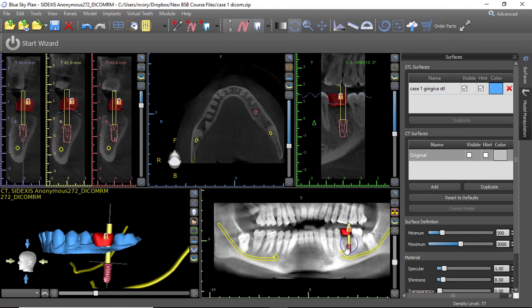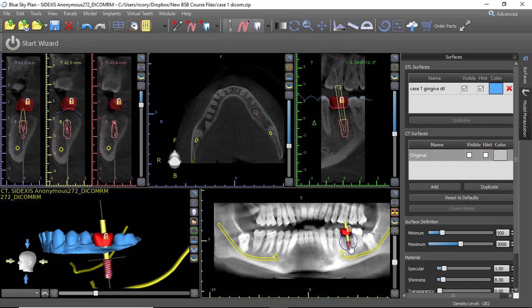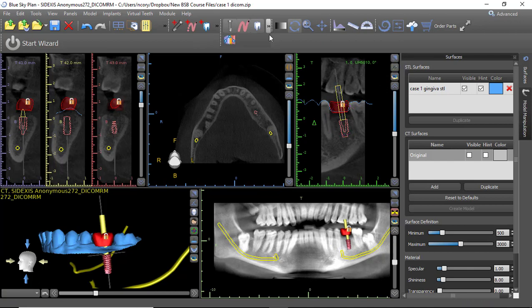Now I'm going to click in the software anywhere you want to drop this in, and it will place the implant. Just like with the tooth, you'll get a rotation ring. You can rotate this so I can line it up to the implant or to the adjacent teeth's long axis. And once I've done that for a rough positioning, this is where that tangential view becomes very useful.